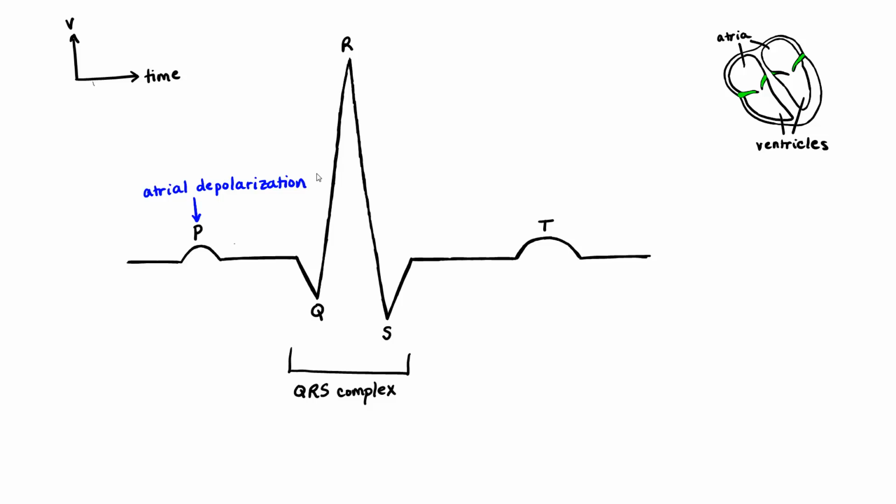All right, now where does the QRS complex come from? Well, that turns out to come from ventricular depolarization. And for now, don't worry about why you get a Q wave that is deep and an S wave that is negative and you get an R wave that is positive. Just consider the Q, the R, and the S to come together as the package and focus more on the R wave, which is way, way positive, because really there's a wave of positive charges moving through the ventricles. Now let's see where our T wave comes from. So that actually comes from the heart repolarizing. That's when the negative charge returns to the cells and there's a wave of negativity that spreads throughout the heart.